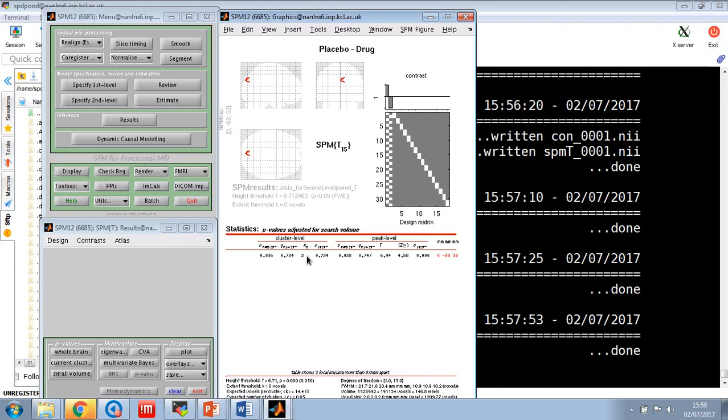Now Karl Friston, who created SPM, would say even 1 voxel surviving family-wise error correction across the whole brain on the basis of peak response amplitude is worth bearing in mind. But I think a lot of reviewers would have problems with it. But you often see people displaying the uncorrected map, and I would do the same thing. I'd show it, and I'd say for illustrative purposes the images are thresholded at 0.001 uncorrected, but the results survive multiple comparisons correction.